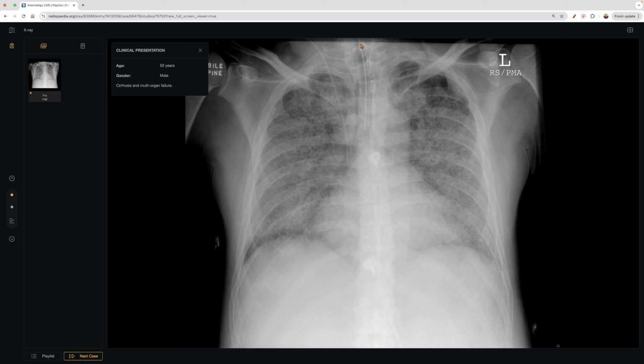And so real quick, we'll discuss correcting tube placement. If the tube is going into the right main stem bronchus, you have to pull back. You have to urgently pull back, right? And that's why you always get a chest radiograph after inserting an endotracheal tube. Then you want to see that the tip is within 5 plus or minus 2 cm of the carina. I can't measure it here, but I'm assuming somebody else did. And you determine whether you need to pull back more.